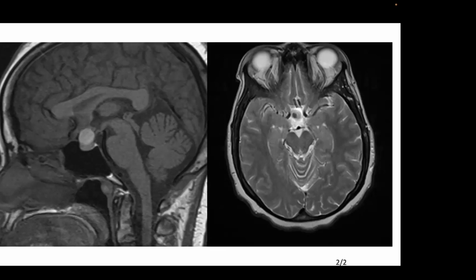So can Rathke's cyst hemorrhage? No, it can be just a small part, which we can often find as a small, hypointense nodule in it. It's not typical to be like calcification. It can be small, but not.